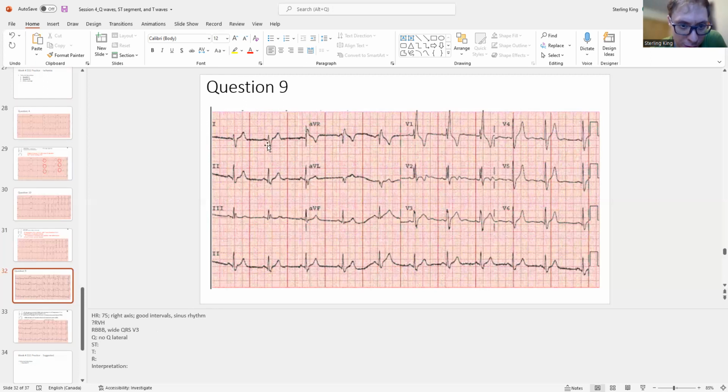ST, oh, that's a little bit elevated. It's maybe a box. This is level, that's a box up. So let's look at this guy. Pretty flat. So no lateral. Looking over here, it's like one box below this line. This is like one, maybe two.